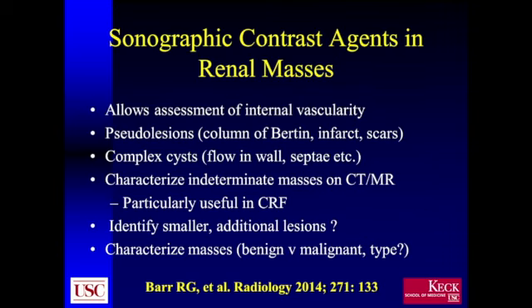There are also occasional cases where even after contrast administration, the degree of enhancement may be insufficient to classify a lesion as benign or malignant or containing flow, and the contrast ultrasound can sometimes help to clarify that. Occasionally, we will be able to identify smaller or additional lesions with contrast ultrasound, although this is certainly not something that we typically use it for.